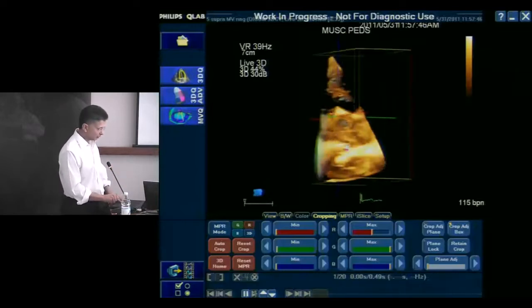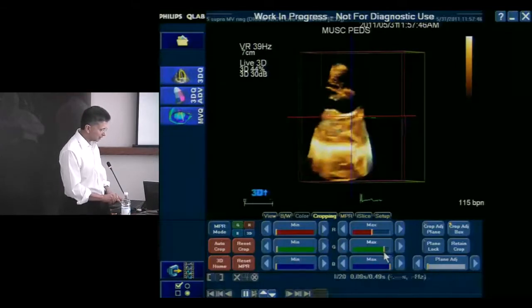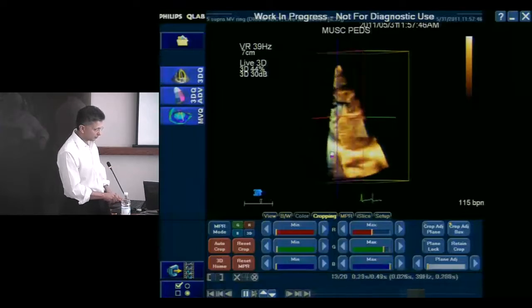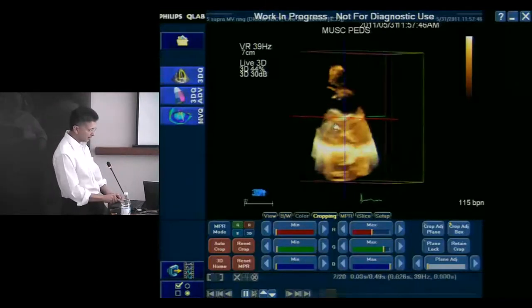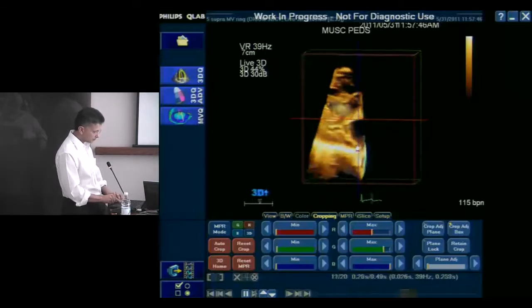So what's that all about? And that's something that you can tell by 2D imaging. I just think it's kind of cool to see it this way as well, like there. So that's one level, and that's the other level of this ring. You see that? It's like concentric circles, like a target. One here, one there. So that one and this one, right there.